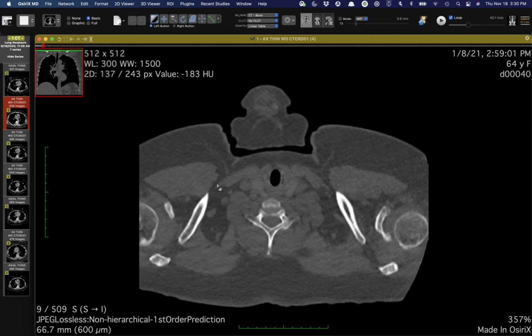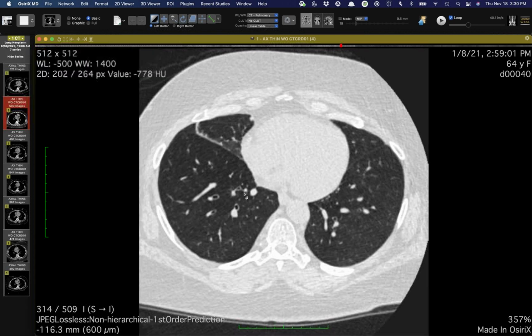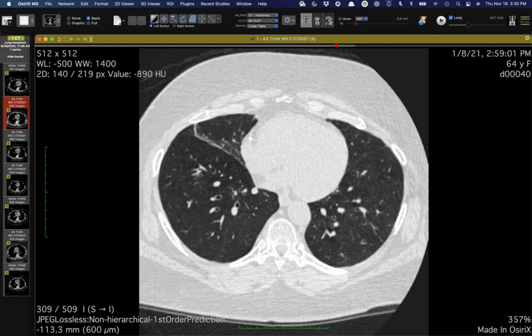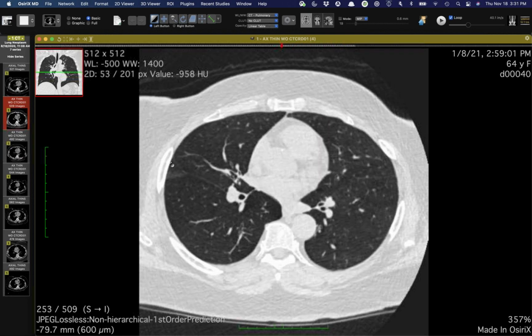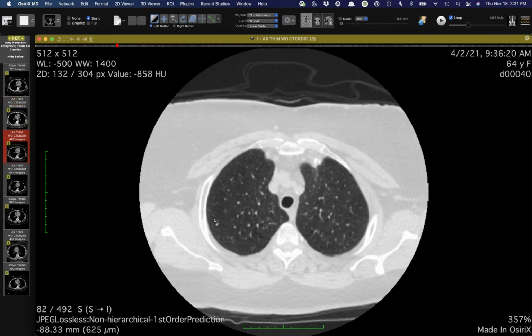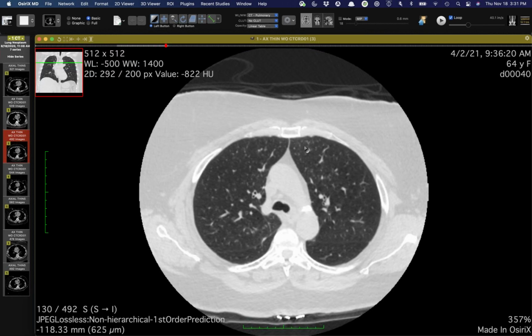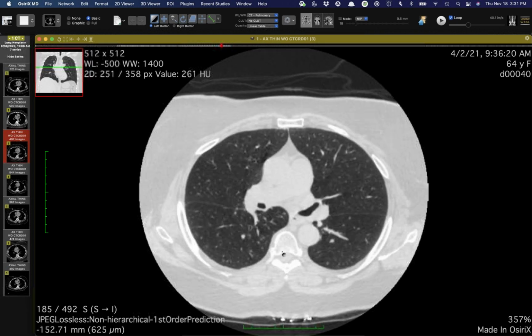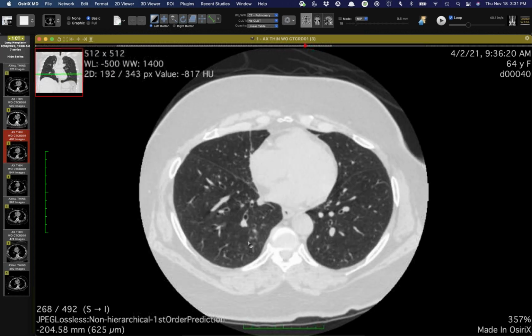Then, fast forward a few months, and you'll see that nodule has decreased in size. They've been given immunotherapy, durvalumab, with, I think, chemo and maybe radiation as well. So that is trending in the right direction. All those other little nodules went away. Then in April, it starts to develop pretty extensive bilateral upper lung predominant nodules. A lot of them you can see are clustered along the fissures here, and they're in the upper lobes, and also in the right lower lobe where that primary tumor was.